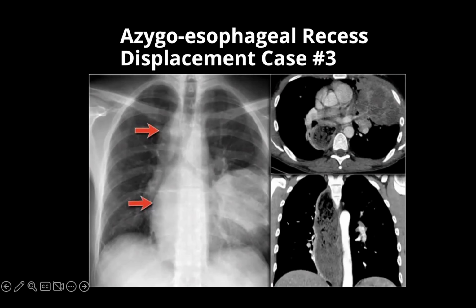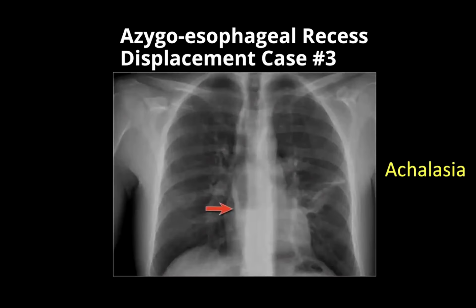And if we look at the CT scan, that basically corresponds to a very dilated esophagus filled with food material. We can see that the opacity projecting on the frontal chest radiograph in the lingula corresponds to a big consolidation there. That's expected because we have that dilated esophagus and then a very high risk of aspiration, as occurred in this patient. So that was a case of achalasia.